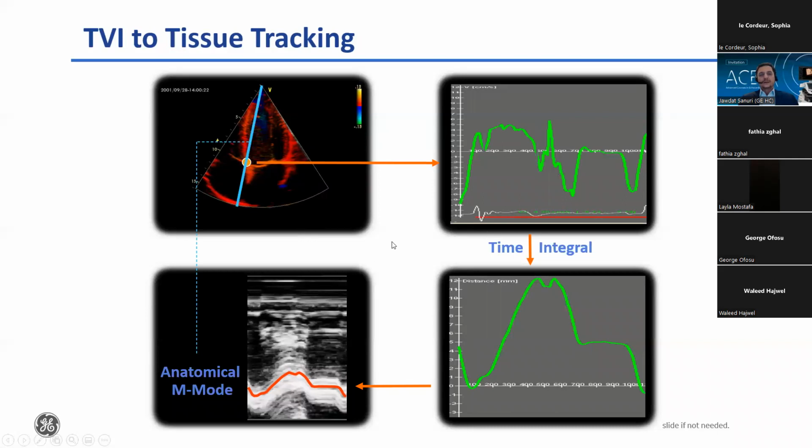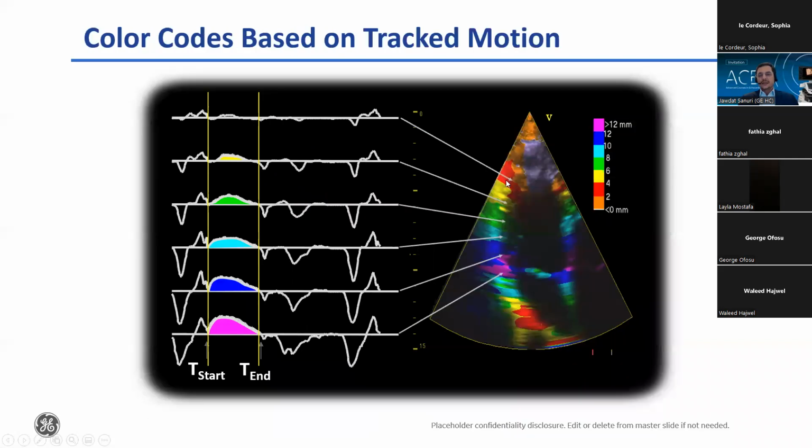And that's how it looks, because each velocity curve is different. Again, the apical ones have lesser peak velocity than the basal ones. Hence, if you measure the area under the curve, the basal one will give you a different, higher displacement, around 12 millimeters, which is normal for an adult, for the annulus and each part of the myocardium.